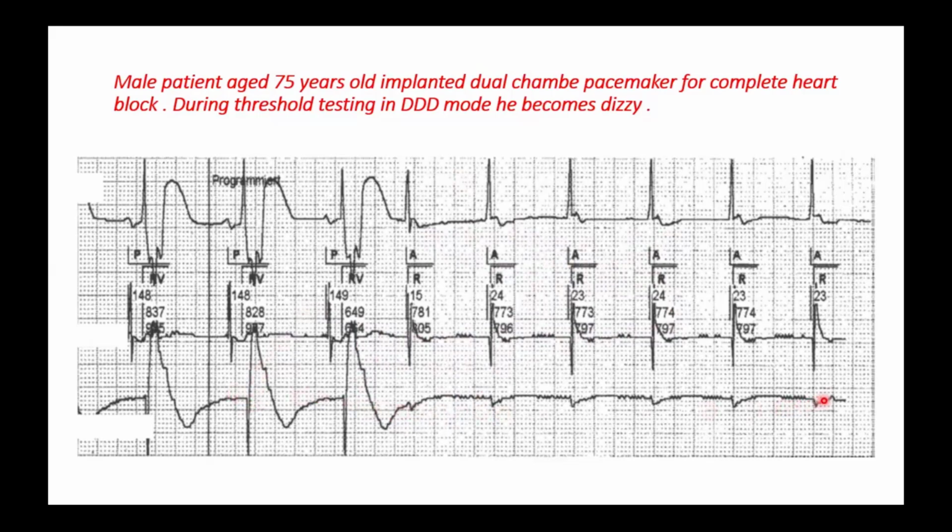In the ventricular EGM, you can see the spike, appreciate the first 3 beats: spike and QRS complex, spike, QRS complex, spike, QRS complex, and then nothing. What is this nothing? There is a far field atrial spike, the small one in the ventricular chamber, which is taken as if it were ventricular activity. This is why crosstalk is dangerous, because one chamber can give false orders to the other chamber that there is activity, and this makes the patient go into syncope, maybe arrest.